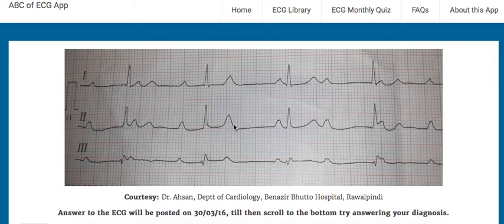Now if you see, this wave over here is formed as a merger of P and T together. This wave is taller compared to these two individually, but basically these two combined together form such a wave, and there is evidence of that over here at the peak, where there is a small bump, one of which is a P wave and one of which is a T wave. Next, 1, 2, 3.5 big boxes, again the next P wave, again the same and again the same.